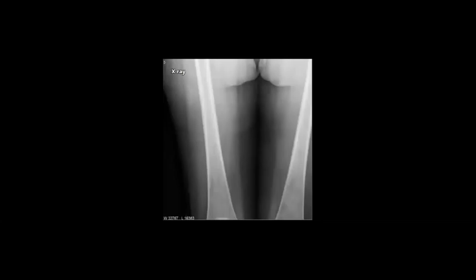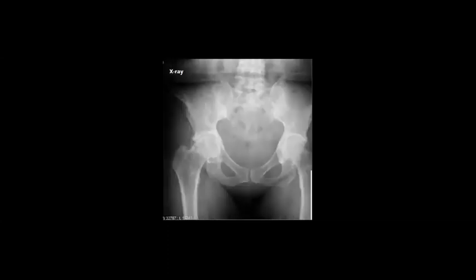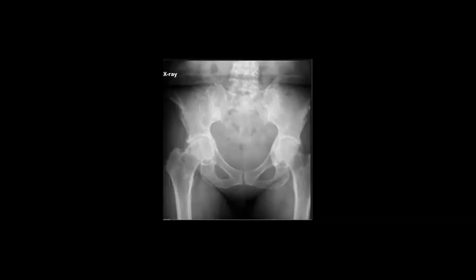Let's go to this case. There is vascular compromise. In this case, you can see bilateral, how do we describe it? Is it increased lucency or decreased lucency? There is decreased lucency. And if I show you the spine and the pelvis, what do you think? I think there is also patchy involvement with decreased lucency.